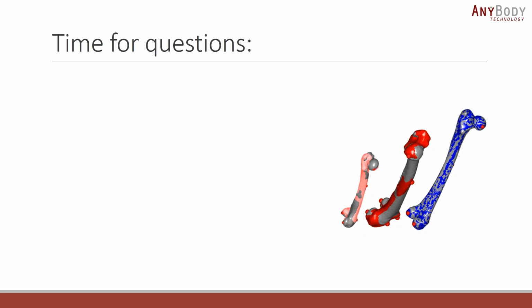For example, the right hand side looks actually pretty accurate, and you can judge the errors by the intersection of volumes. It is actually quite low, so the surface is almost identical. But generally speaking, it is not difficult to go all the way to the STL surface if you have the data. So if you have the data, I would recommend using all of it, because it comes almost for free. Okay.